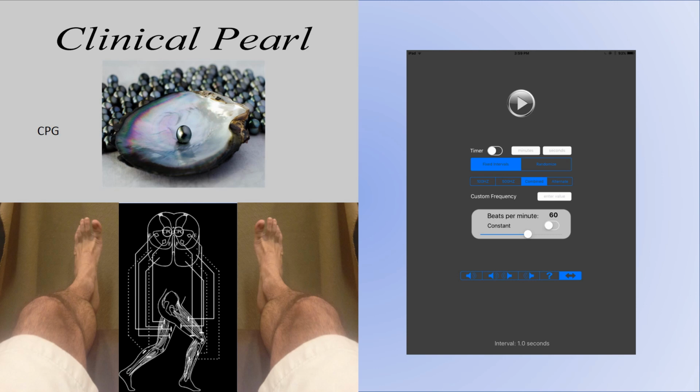Okay, this is the application setup for using the Tone Pacer to stimulate central pattern generators for gait rehabilitation. And once again, the science behind all this is available or will be available on our clinical pearl videos on our website. Let's discuss the setup here.